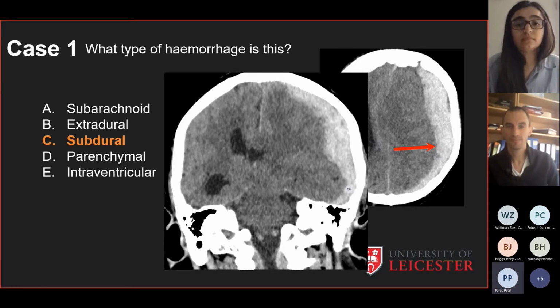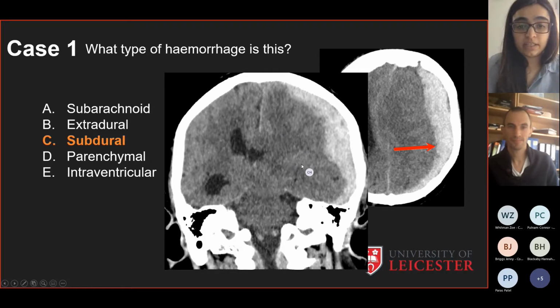There's a midline shift and there's a loss of the ventricular spaces as well, signifying increased pressure in the brain. Yeah, fantastic. So you've got loss of your ventricles on the left side here, so you're unable to see it. You've got asymmetry. You've got a shift in the midline, and that's got some parafalcine herniation coming through. You've also got dilation of your ventricles here. So the dilation of the ventricles with the absence on the opposite side would suggest that you've got hydrocephalus, and that would become a neurosurgical emergency and hence referral to the neurosurgical team.